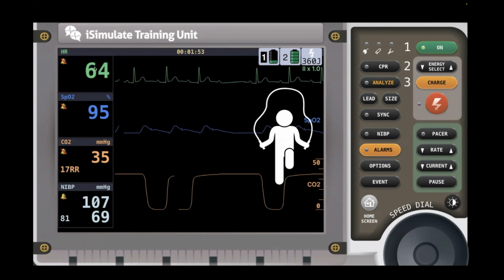The heart rate is 64 electrically, but it's not in terms of perfusion. We're getting these pauses here. So this is a second degree type 1. So this person has a second degree type 1, just kind of a gee whiz thing. This is actually an AV nodal problem. The AV node is sending it down the fast side, sending it down the slow side, holding it longer in the slow side, and then just not even transmitting that beat.